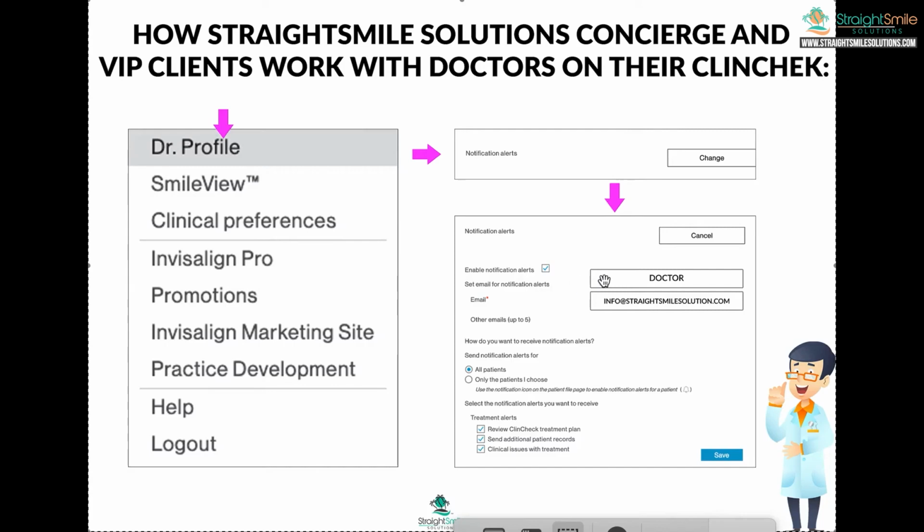You have your email there, maybe your office email, your front desk. I would put that in there, and then put our email in there. Okay. There's a typo. info@StraightSmileSolutions, plural.com. Okay, don't do that.